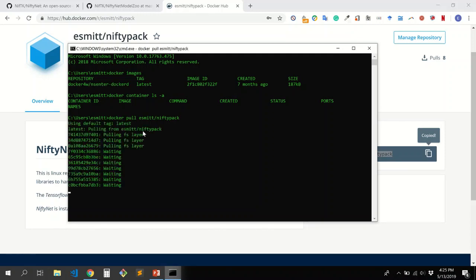In the Docker Hub registry, you can have several labels and tags to know which version you are using. In my case, I use the default tag. This is the last one that I created, and it's downloading. You can see the downloading process is very fast because it's using several connections. This command downloads my container to my machine in order to be executed.